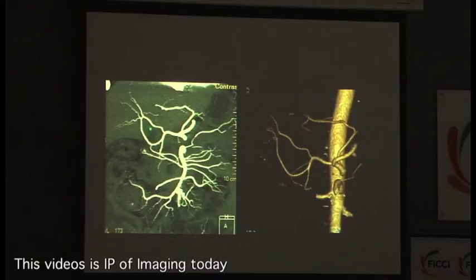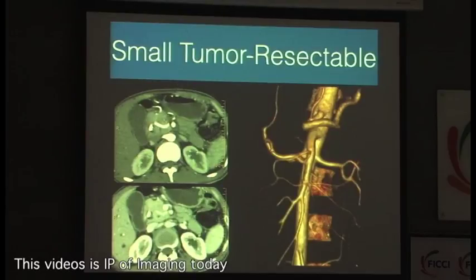Now this patient has two separate right hepatic arteries, and one is arising almost from the GDA. This is a matter of nomenclature, what you call it, RHA arising from the GDA or the GDA arising later after giving off the RHA. But the moral of the story is that the tumor is extending till here, and if the surgeon goes up to try and clear off the GDA, he may go and tie off the RHA. You have to tell him again that your RHA is arising almost from the lower part of the GDA. So that's another thing, that's where he ties off the GDA.